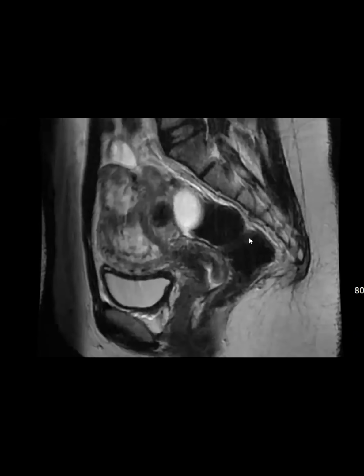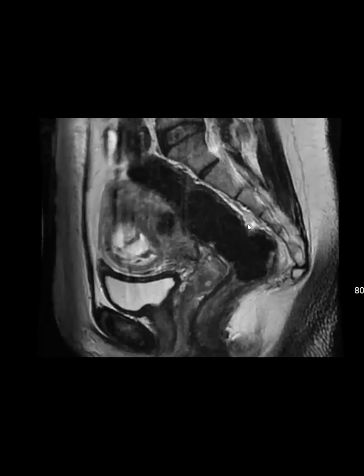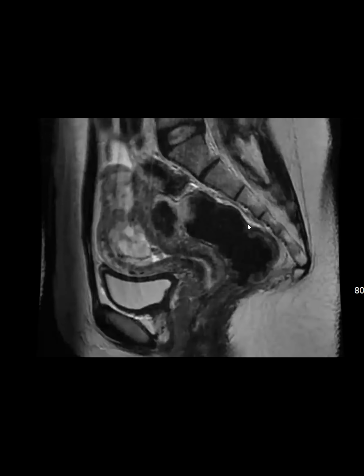So this is a young lady. The history I got when I started reading this case out was they were pregnant, and at a first trimester ultrasound, it was noted that the sac didn't exactly correlate to dates, and they had spotting. They didn't really see a viable gestation, so they went to curettage.